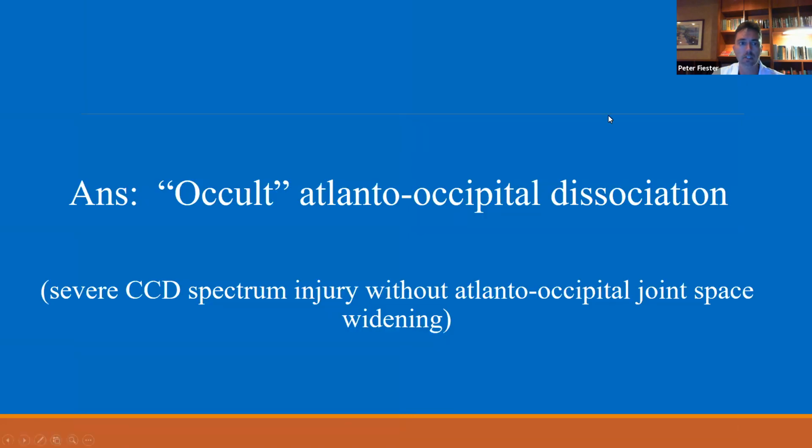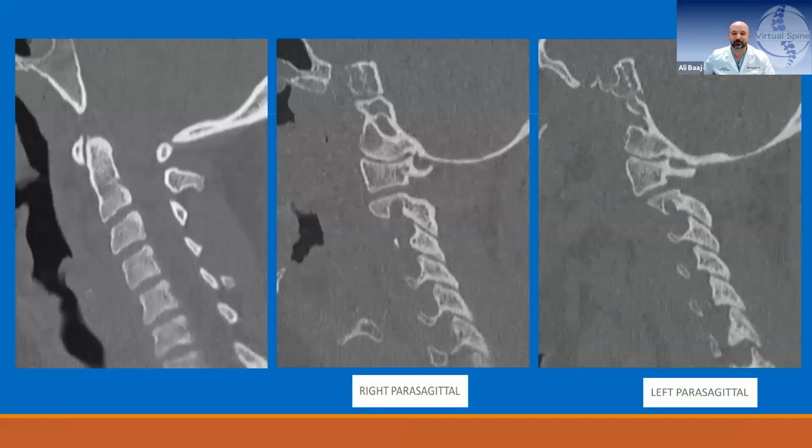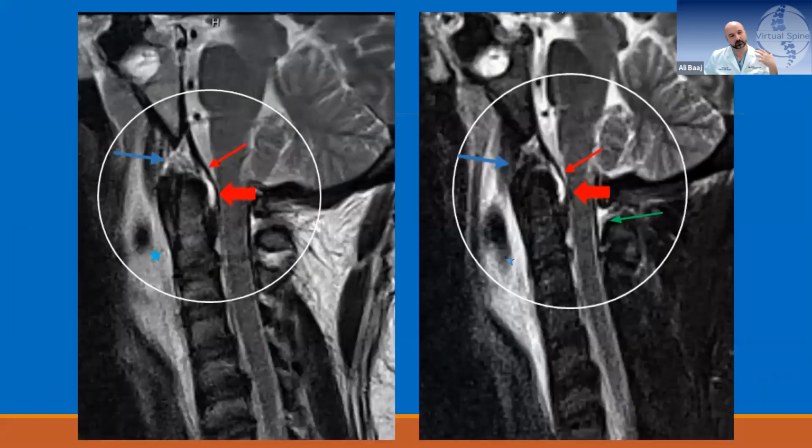That's actually a really awesome case. Can you go back to that CT or MRI, please, Peter? See what Jonathan thinks. We obviously have several surgeons with us online here, so please feel free to type in your answers. But this really brings up a very important issue for us as surgeons, because if many of us look at this CAT scan and clinically the patient's okay, we may or may not offer surgery. Then you see that MRI and there's that added information of torn ligaments, and the neuroradiology report is very scary because everything is disrupted and torn.